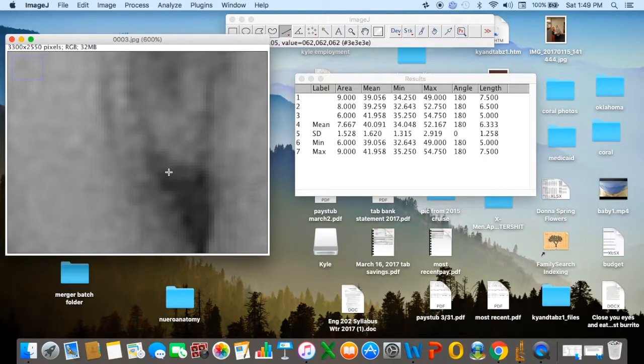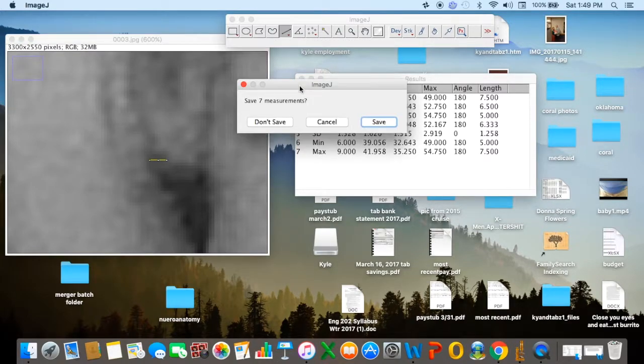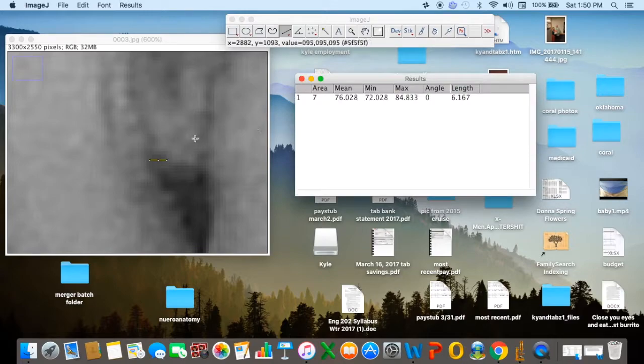Once again, the most superficial space, and you can see the curve of the tooth right here, the presence of the lamina dura here, and I know it's pixelated, so we're going to attempt to measure the darkest pixels. In this case, I didn't go quite far enough. We'd want to go right there to right there. Once we start getting into those wider pixels, that's when we're really into the lamina dura.